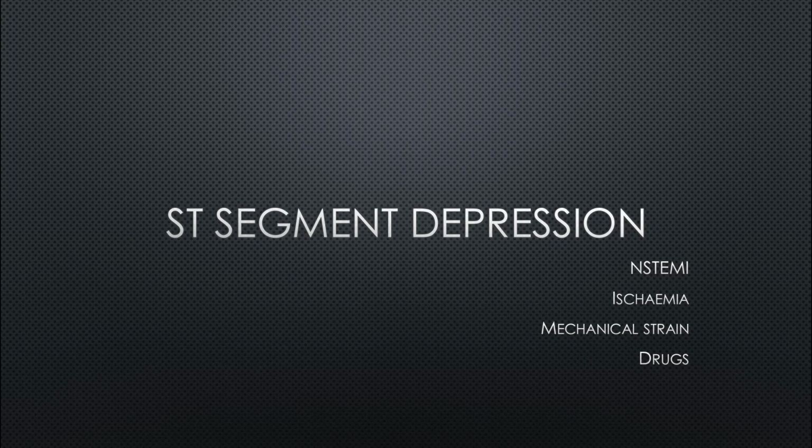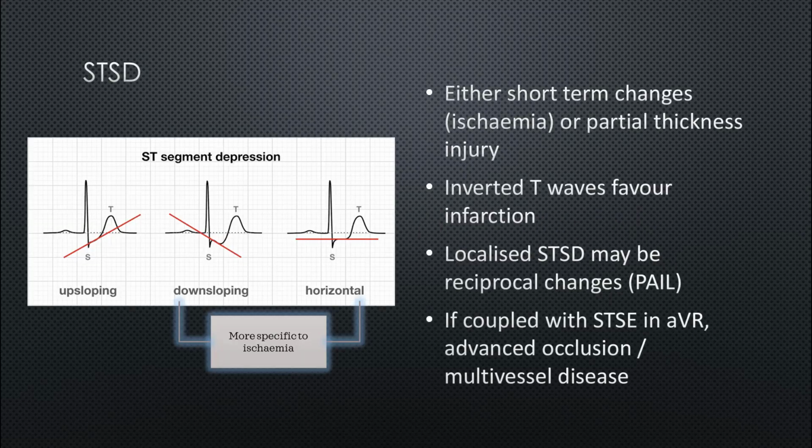So paramedics are going to have to consider the morphology of the ST changes. They're going to have to look at the distribution of the ST changes and concurrent factors such as axis and QRS amplitude to make a final determination. But for the rest of this segment, we're going to concentrate on the changes that are associated with acute cardiac syndromes. So the changes associated with an infarction or an acute cardiac syndrome reflect a disruption of subendocardial repolarization around an injury that's not transmural, so that's a partial thickness MI.